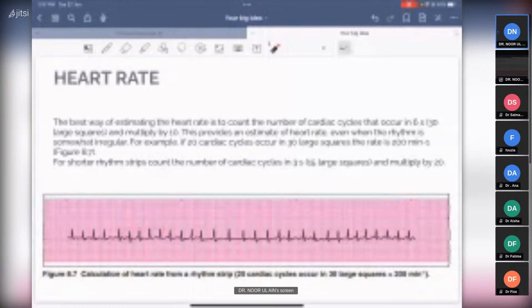And trust me, when you first see an ECG strip, you will know on the spot whether this is a regular or an irregular rhythm. देख के पता चल जाता है. Don't jump, don't assume anything when you see an ECG. Try to find out, yes, but don't really push yourself so hard. The moment you see an ECG strip, you can literally see कि RR interval constant है या नहीं है, so it is an irregular rhythm. Then the method that Dr. Saeed wrote is not applicable. Okay.